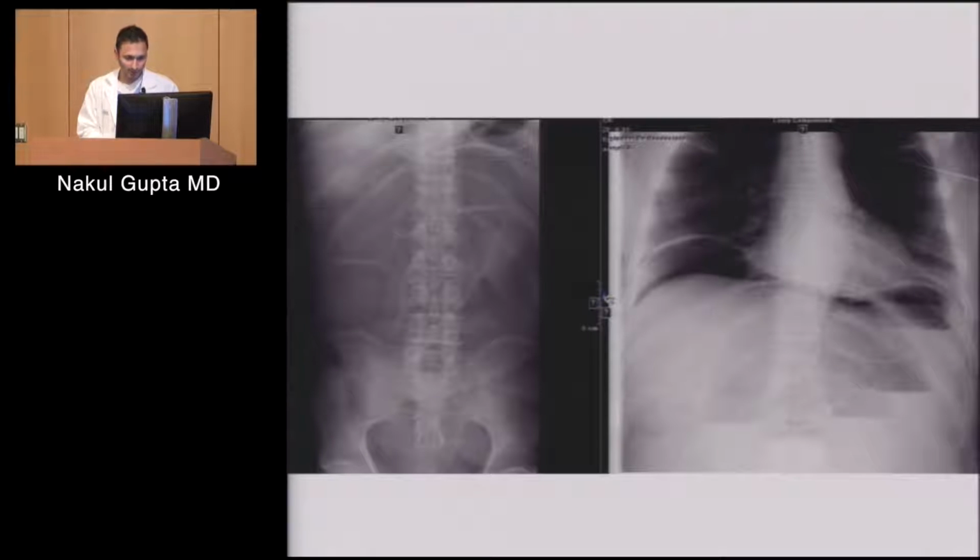All right, so a few examples here. I'll let you guys take a look at these for a second and see if you get an impression of what you think is going on. I'll point out a few things.